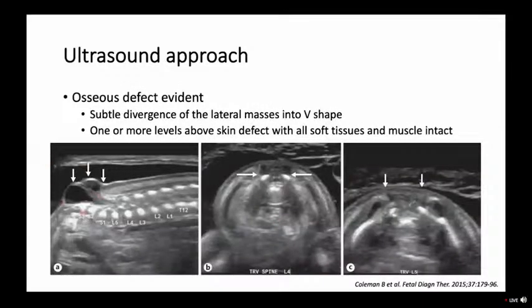This is obvious. Spina bifida, what we call a myelomeningocele. Why? Because you can see the cauda equina, the spinal cord, actually in the defect. We don't want to just say, hey, there's a sacral spina bifida. We really want to look at and count the vertebrae and say, okay, where's the uppermost lesion? Well, this is probably like an L4, L5 because there seems to be a bony abnormality here. Maybe provide a little bit more information in our reports because the upper level of the lesion ends up being the one that's the predictive one.